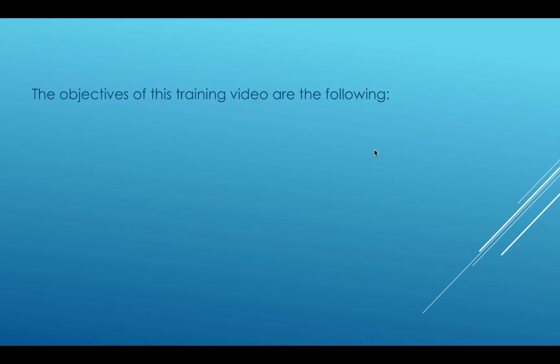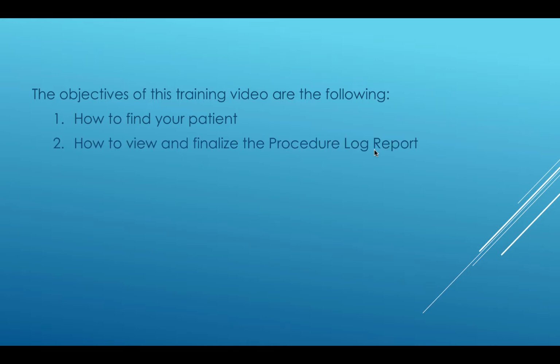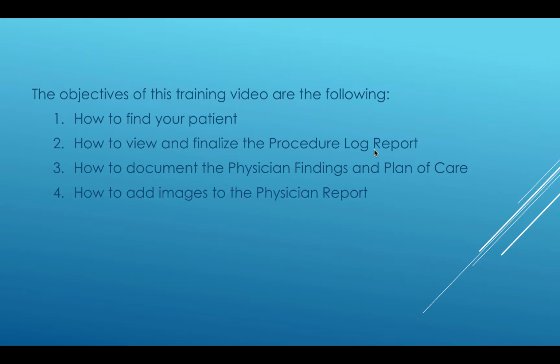The objectives of this training video are the following. 1. How to find your patient. 2. How to view and finalize the procedure log report. 3. How to document the physician findings and plan of care. 4. How to add images to the physician report. And 5. How to view and finalize the physician structured report.